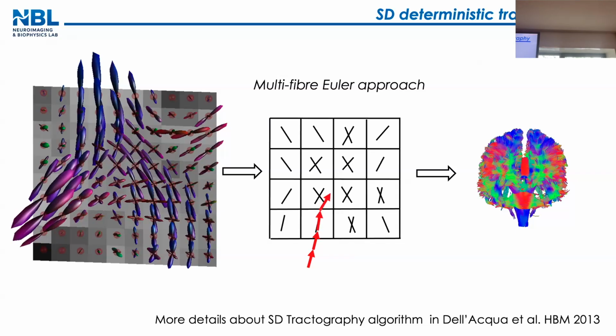But now we are here, and which one are we picking as a direction to follow? So there are different opinions. There is no right and wrong. There are different ideas of tractography, okay? The most common choice, and the one we also follow, is to keep, we want a smooth change of direction, and we don't want sharp changes of direction.